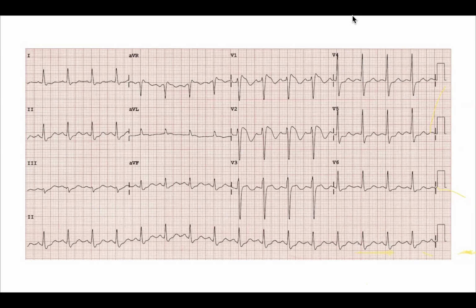Brugada syndrome. Here you can't say Brugada syndrome; you can say type 1 Brugada pattern. Again, in the history, what will you ask in this patient? One thing is syncopal episodes. What else? Family history again, of sudden cardiac death. So these two entities are very important. If we see this type of ECG and syncope, we are definitely going for this.